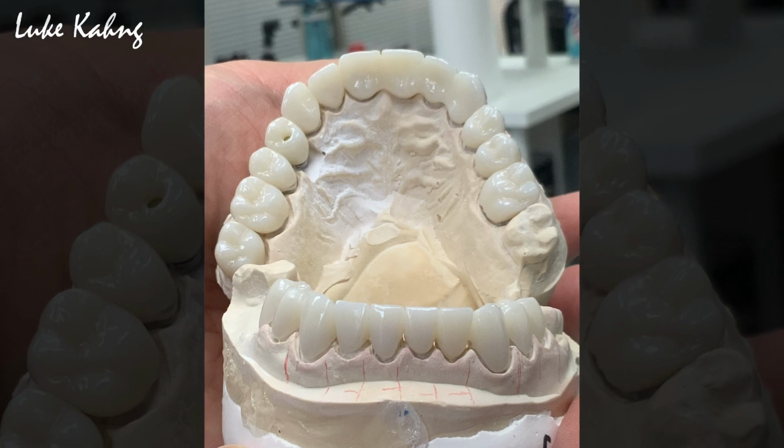So why do I make the video all the time? People are asking me, look, what is the difference than the others? The reason is I made the documentation for you guys, because I'm in the cases. I did not do it all the time, but I work with my crew indirectly, just a perfect relationship. We talk together regarding the mounting. It just has to be right from the die trim, and then set the mountings correctly.